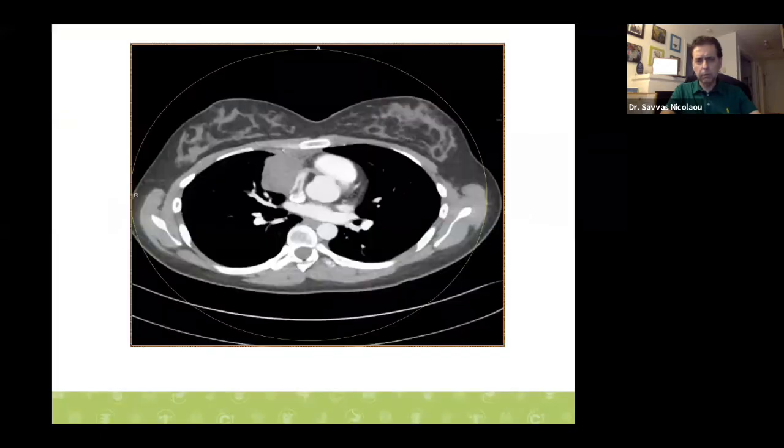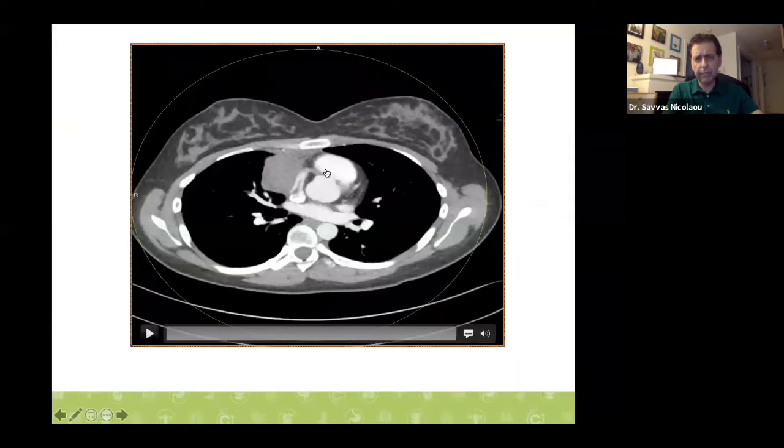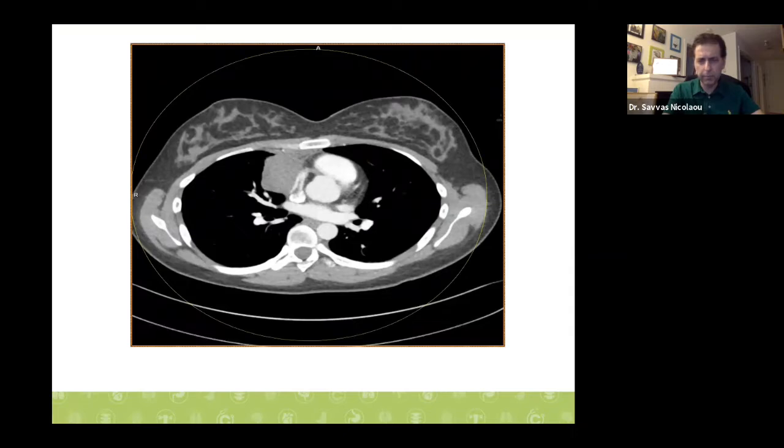23-year-old female. There was a concern regarding acute chest pain. Of course, what we can do with CT, not just black and white imaging, but we can also do multi-energy imaging where we can see the distribution of iodine based on the blood supply within the lung. And this unfortunate young female had a thymoma, a mass within the anterior mediastinum, and what needed to be determined, do they have a pulmonary embolism?